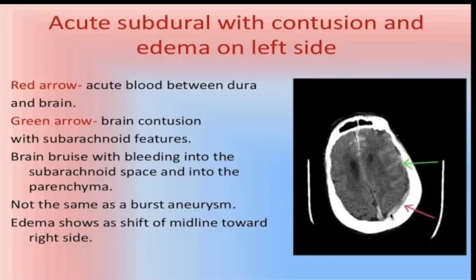Okay. Now, a subarachnoid hemorrhage, however, as I said, is bleeding that we would see by comparing the sulci on both sides. So this is how we should be guided whenever we're looking for it.